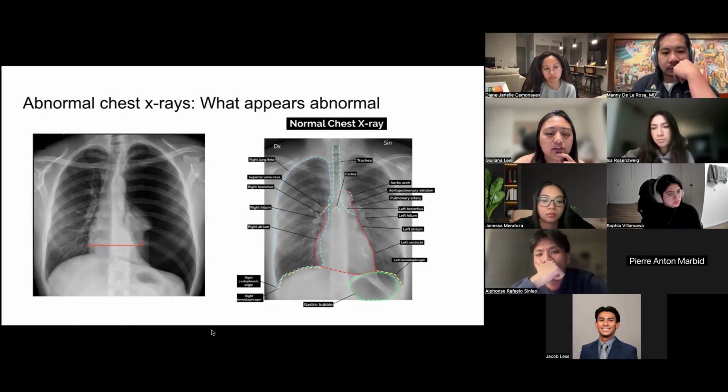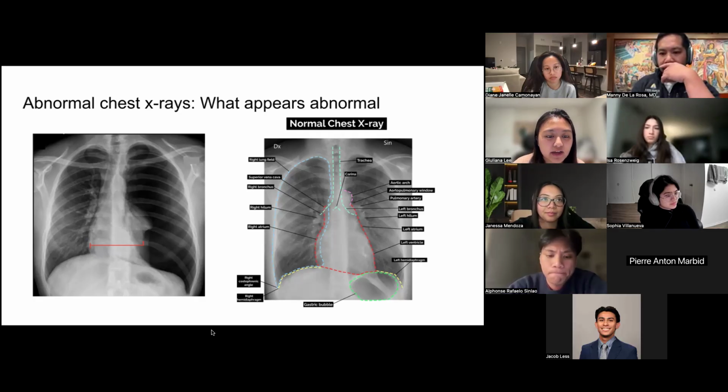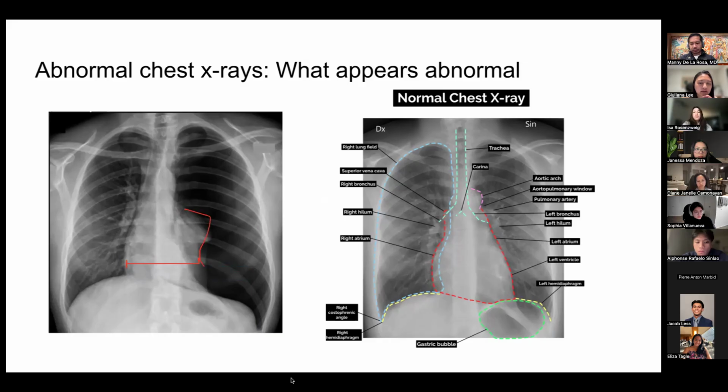And then for D, why am I forgetting what D is? Diaphragm, we do see unevenness of the diaphragm that likely has to do with the pressure difference. And then E, everything else, I didn't notice any hardware or anything particular, but I think that lung outline is certainly one that we want to notice. So on to the next slide.